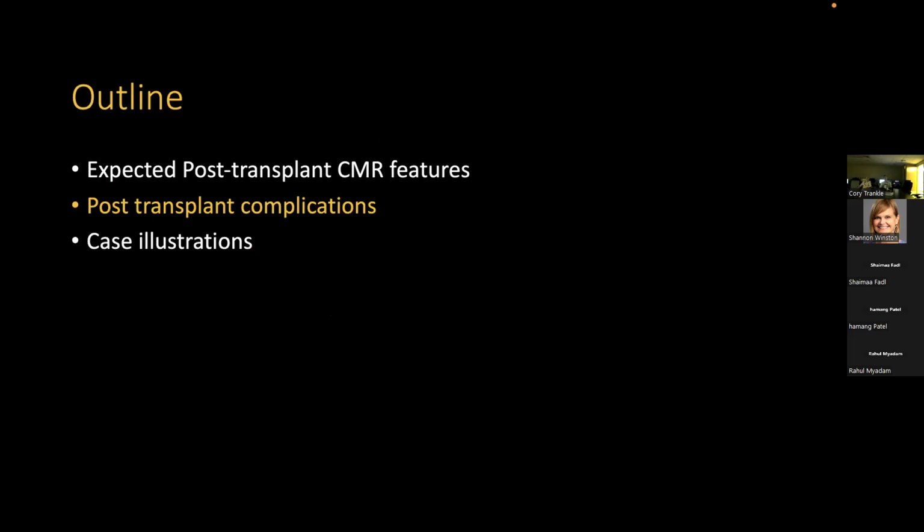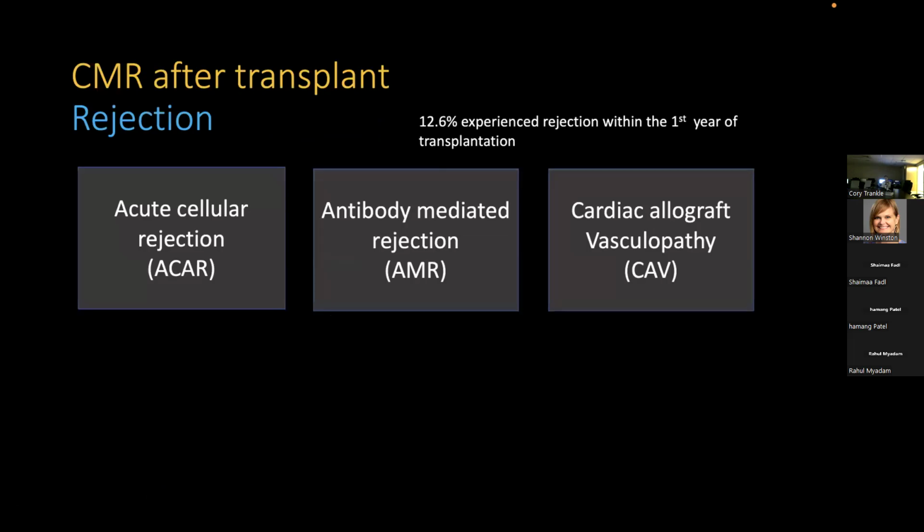Knowing that, let's talk a little about the post-transplant complications and the role of cardiac MRI in those patients. We are starting with rejection.